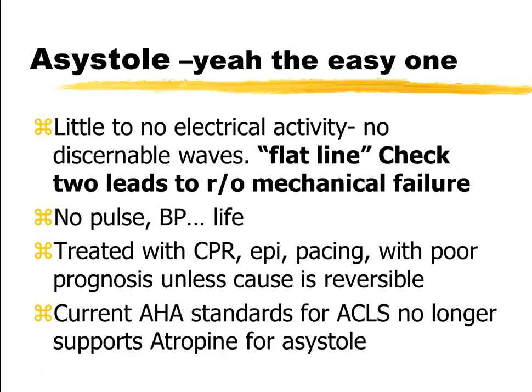Now, asystole. Awesome, finally something that anyone can learn how to do, right? You've got this one already. You know what this is because you've seen at least one medical show on TV or a movie. This is where we have no electrical activity, or a flat line. Now, if you see that, you want to look at your patient. Do they look like they have a heart rate? If your patient is looking at you in the eye and you see asystole on the monitor, then you better check your leads because something's disconnected, something's not right. If they do not look like they are alive, like they have no pulse, no blood pressure, then you need to start CPR because there's no heartbeat going on.